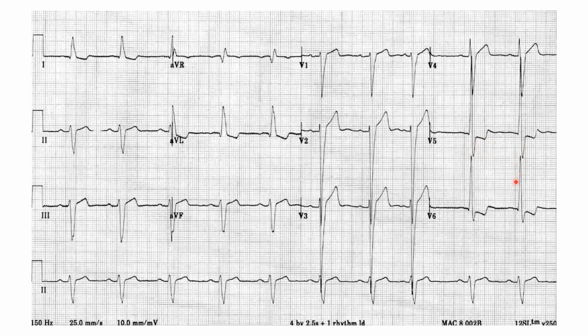And then if we look in V1 to V3, okay, V1 to V3, we also have some ST elevation, okay. So the reason for this ST elevation isn't fully understood, but it is present sometimes. And then if we look at leads V5 and V6 again, we have that typical left ventricular strain pattern. Let's take V5 for example. We have some ST depression, but then in V6 we have ST depression and also we have some T wave inversion. Okay, so that's that left ventricular strain pattern.